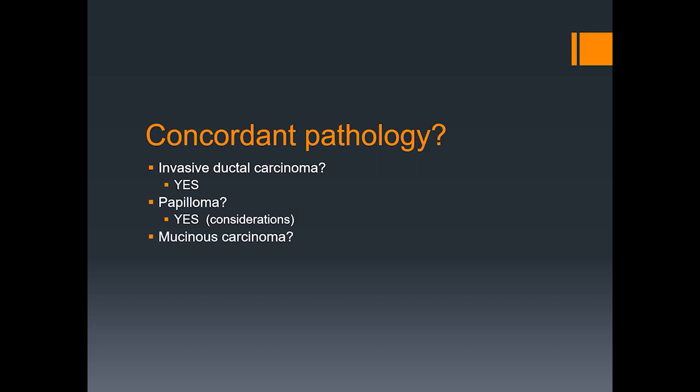Mucinous carcinoma? Well, when we consider this and how it behaves in the setting of overall invasive ductal carcinoma, I would argue that yes, mucinous carcinoma could be part of the differential. While not essential that we consider subsets of invasive ductal carcinoma in our RAD-path correlation, this would certainly be within the realm of this lesion.